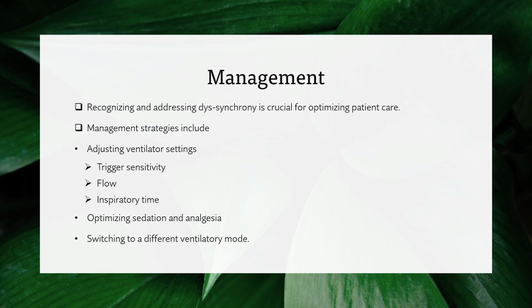The management strategies include adjusting ventilator settings like trigger sensitivity, flow, inspiratory time, optimizing sedation and analgesia, and potentially switching to a different ventilatory mode. Healthcare professionals can detect dys-synchrony by observing the patient's respiratory efforts, monitoring ventilatory waveforms, and assessing patient comfort.